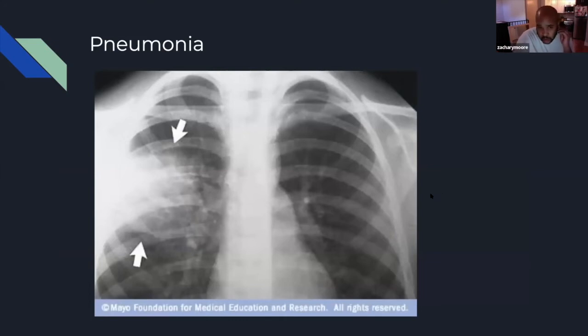But the whole purpose of my talk today is just to identify pneumonia and the signs of pneumonia on ultrasound. We all know the clinical signs of pneumonia. This is just a chest X-ray displaying a consolidation. Typically, when you have pneumonia, the alveoli are intensely inflamed, and you might have areas filled with liquid, fluid, or pus, and this is the consolidation that we see. It could be widespread, it could be patchy, it could be lobar. But overall, ultrasound can detect all these pulmonary changes as long as they involve the outer, non-mediastinal pleural surface.